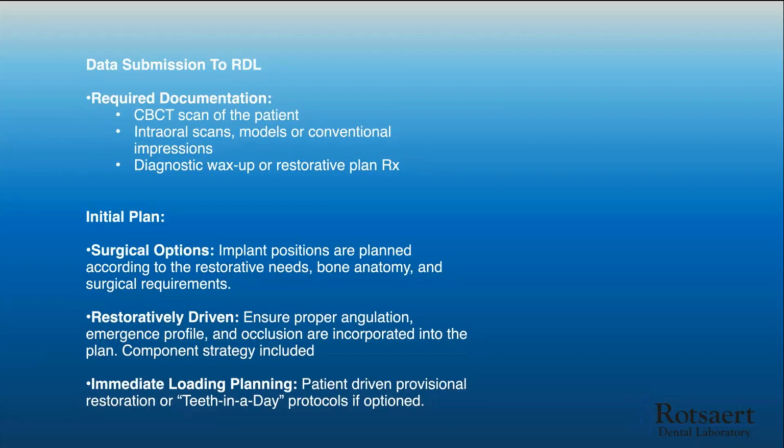So with the implants, it's really not that much different. The implant designs, and you'll hear about BLX, you'll hear about Noble Active as well, but those implants are more like augers, where they're designed to go into softer bone and really grip. There's a learning curve to those, but they grip really well.